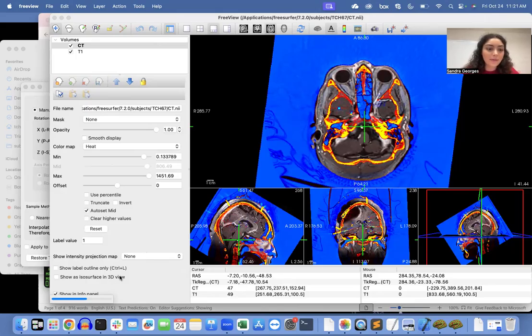And then there's a couple of steps where we're going to utilize different types of scans. We like to go onto the Epic folders and the procedure notes where they have, I guess, the reconstructed 3D view of the brain, and they have the electrodes labeled. So we'll take a look at that in the next part. That is where we're going to pick out which electrodes we want from the brain and then put that into our POM registration file.